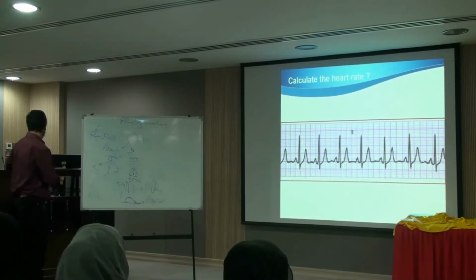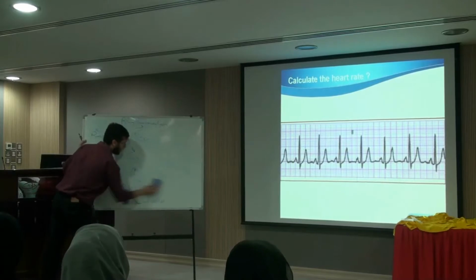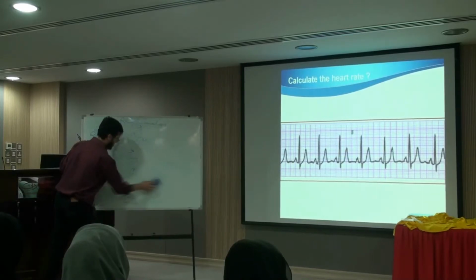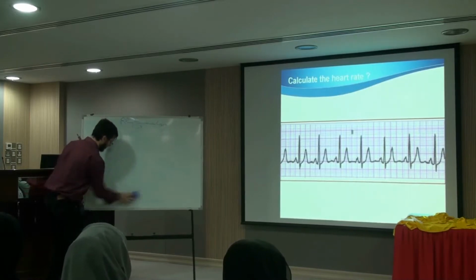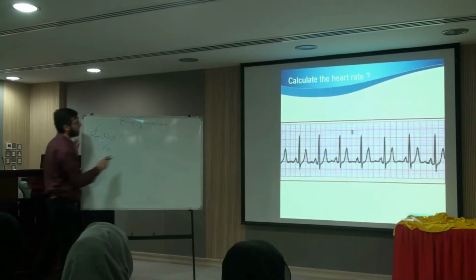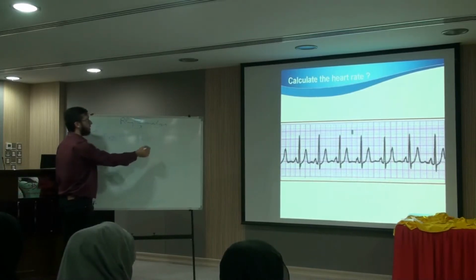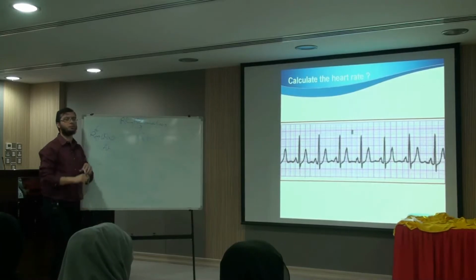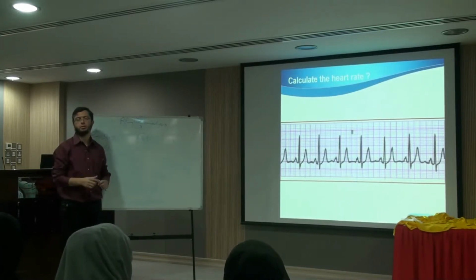Okay. Now regarding the QRS complex, the normal QRS complex is narrow or wide? Narrow. Why should it be narrow?